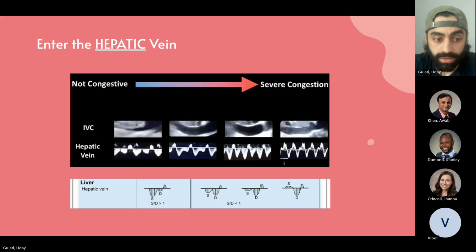And so in a normal patient without chronic remodeling, without tricuspid regurgitation, without AFib, your hepatic vein is a surrogate for your central venous pressure waveforms. It's pretty much the same venous waveforms, just you're looking at different things. And what's happening here, once again, is that the hepatic vein is not dissipating that capillary resistance. And so all that compliance ability to cushion is gone, and that's why you start to see pulsatility. Remember, in the vein, you really shouldn't see pulsatility.